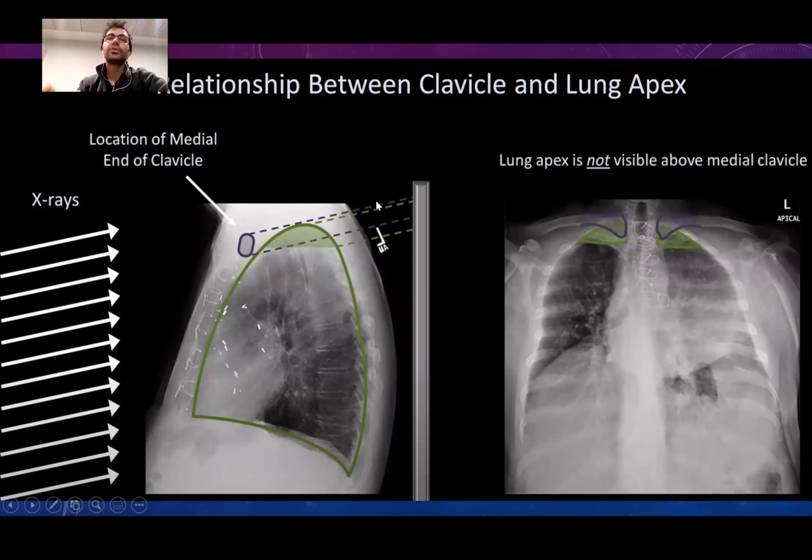So when you're shooting from below the patient, in the caudocranial axis, with a little bit of angulation, then the clavicles are going to just superpose to the apex of the lungs. So you're going to have a hard time evaluating the apex. So this patient has technically bad angulation. But more than that, just don't look at this area. Look at what happened to the other organs.